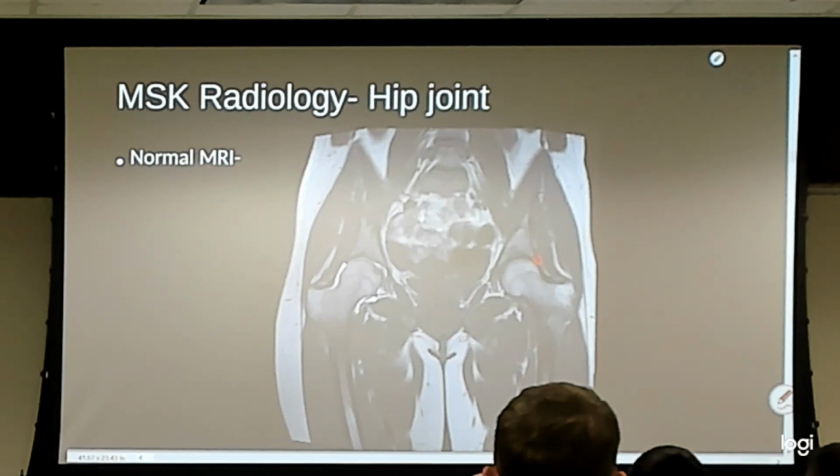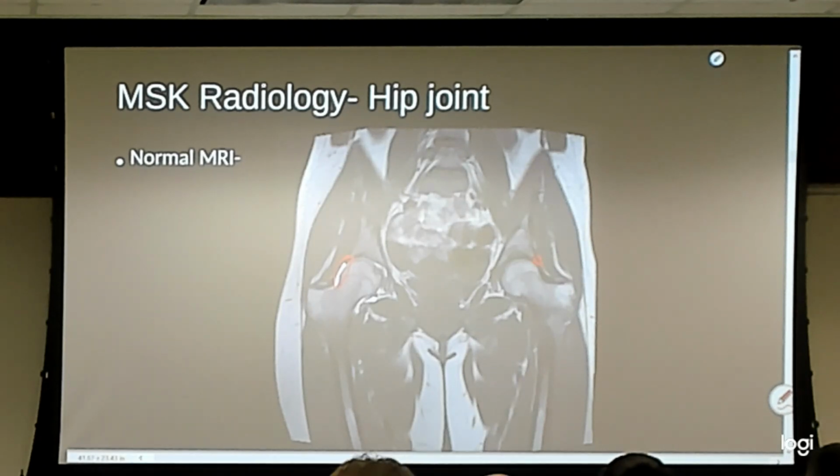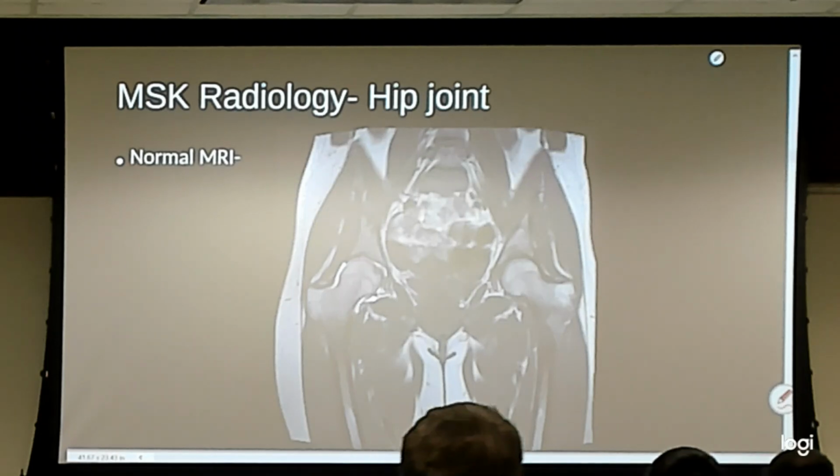You would probably do better doing the sagittal cut on that. Let's see here. So how did I determine that it's contrasted? So we can see that bright white fluid there in the joint. It's different than on the other side, where it's just a dark color. What else can we tell from this picture? Oh, we can kind of see a fovea where that ligament attaches. We can tell the bone density, whether there's any bone edema, being that white fluid within the bone, which I don't see here.